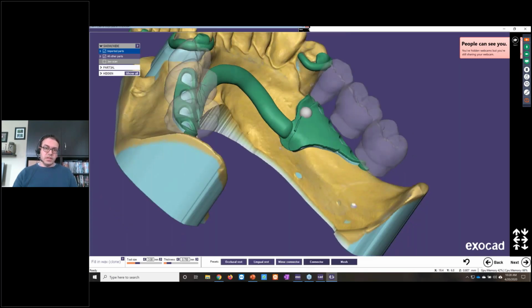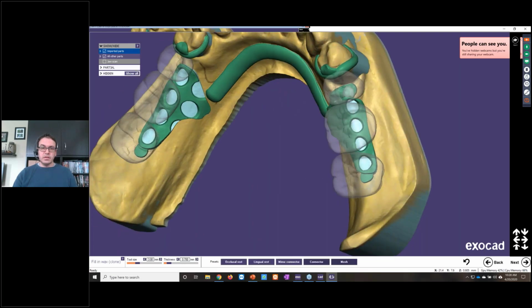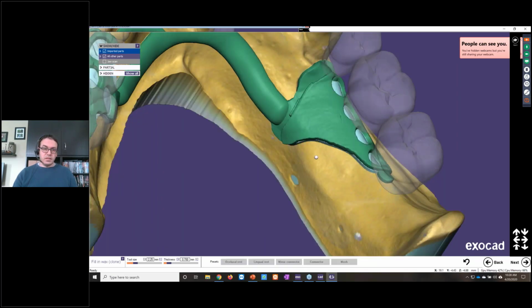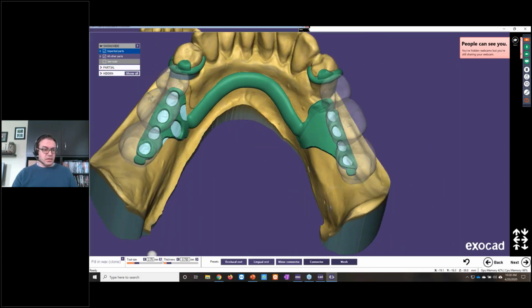That'll be a smoothing tool that we can use later on to blend and create smoother transitions between our different levels here. Make that all look connected and uniform here. Then to finish that smaller section there, I'm just going to change the tool size diameter and make that a little smaller here. All right, then let's repeat that on the other side.